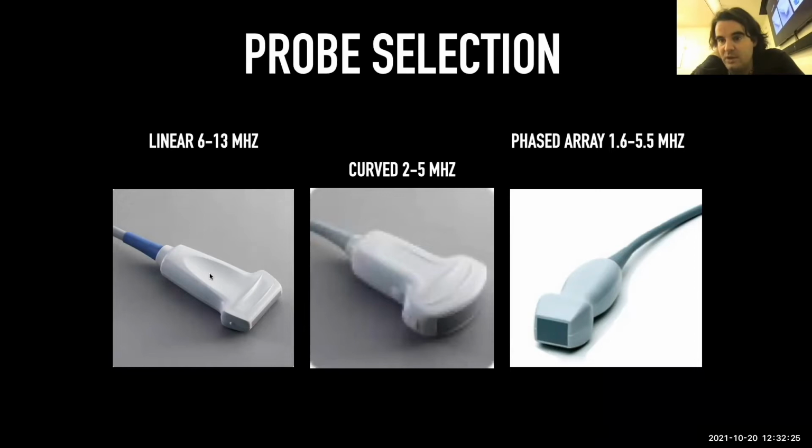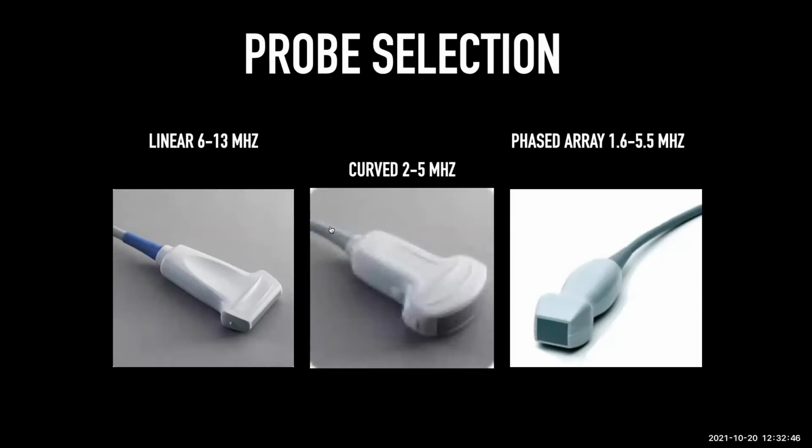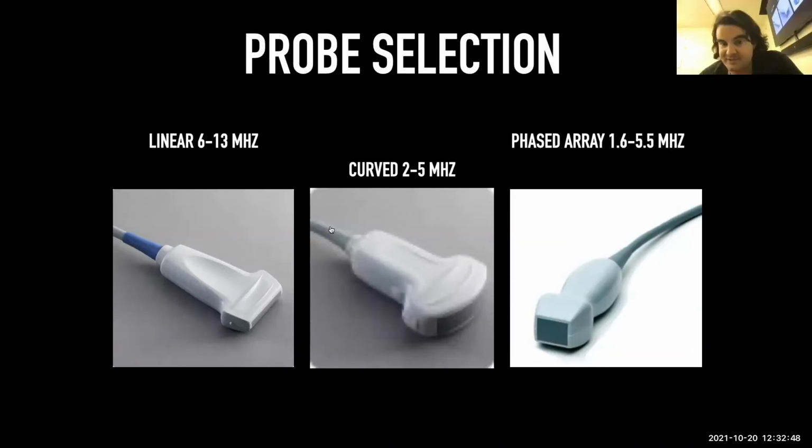But when there is frank pathology like consolidation or pleural effusions, it's actually no longer an artifact at all. It's just lung and fluid. So an artifact would presume that it's not in fact there. So A lines and B lines are useful artifacts, but they are artifacts. But pleural effusions and consolidated lung are in fact just things you're actually seeing.